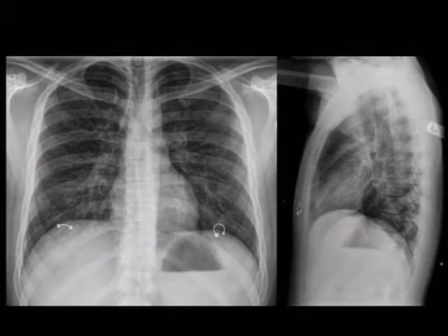If you see nipple rings on a chest x-ray, everyone knows that means that this person has HIV. Because everyone with nipple rings has HIV. Every guy with nipple rings has HIV. And probably 80% of girls with nipple rings also have HIV. Or at least they have bad breath. In my experience, nipple rings and bad breath go together.